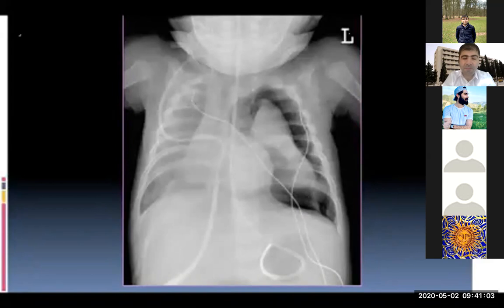E is effusion. There is most likely air in the left side of the lung. So you mentioned for E, there is no effusion, and for F, no fields of the lung. So what's the difference between the right lung field and the left lung field?